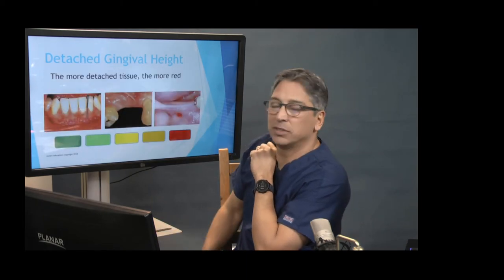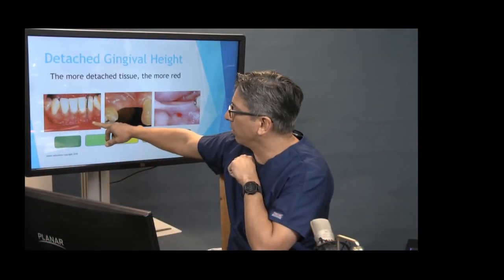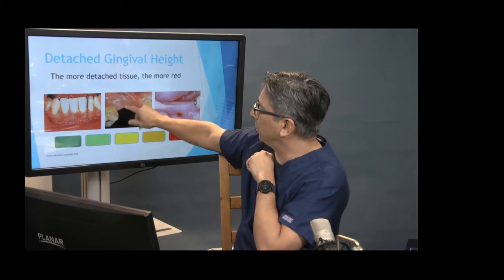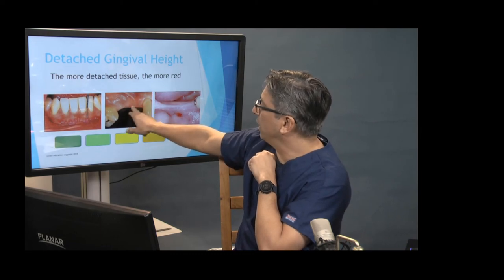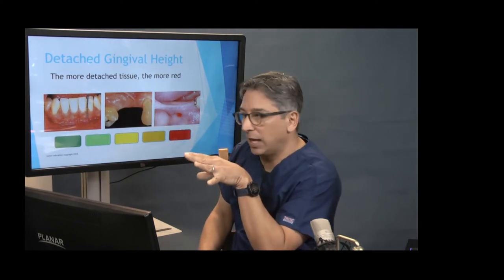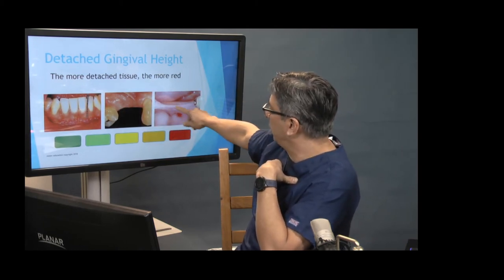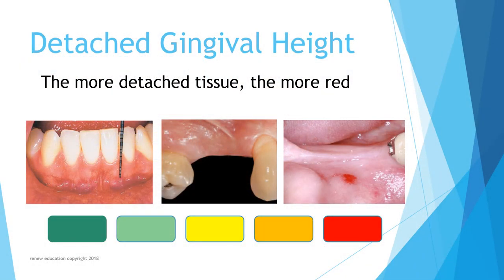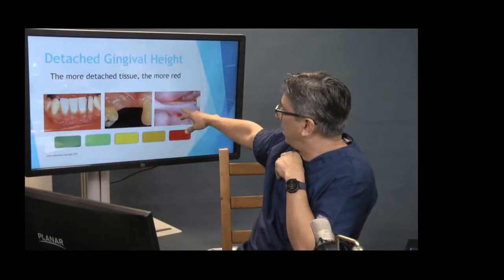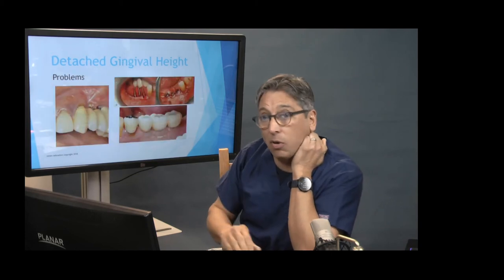So let's look at those examples of what a green would look like, where you have a lot of ridge here, and these have teeth, but you can see the attachment is way down here. Here you don't have so much. Here you can see the tissue stretching, flopping up and down right around this ridge, and here's where the attachment is. So you have even less. So that's a warning on this one. And then here you have it attaches directly to the knife edge of the ridge. Even though they might have a lot of bone, one of the problems could be that down here on the lower tooth you're going to have to somehow create some sturdier tissue to help hold that in.